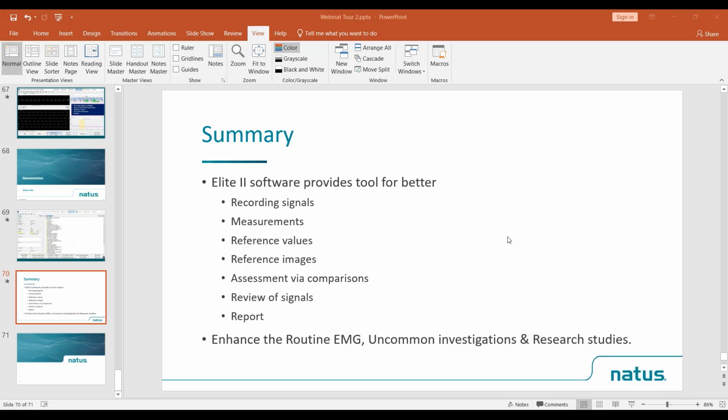How does the Natus EMG system actually calculate the firing rate? Is it something to do with the feedback system of the muscular system? There is no system that calculates the firing rate properly or correctly at all times. On the Natus system, there is something called firing rate that represents a kind of cumulative firing rate.